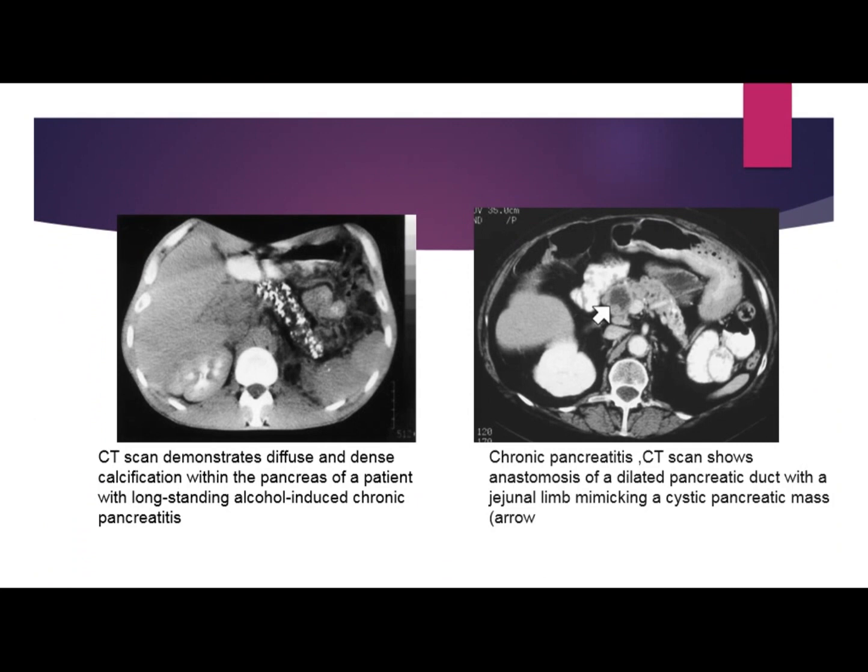Here, chronic pancreatitis, CT axial without contrast. This is the delayed phase post contrast. Anyway. Okay. Axial section of an alcohol abuse patient showing dense diffuse calcification of the pancreas.